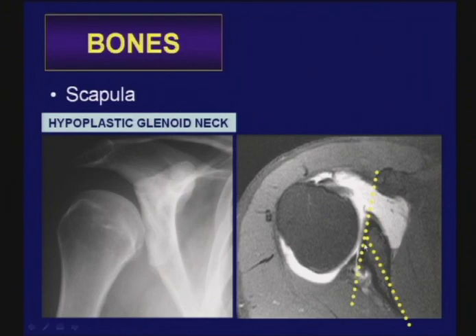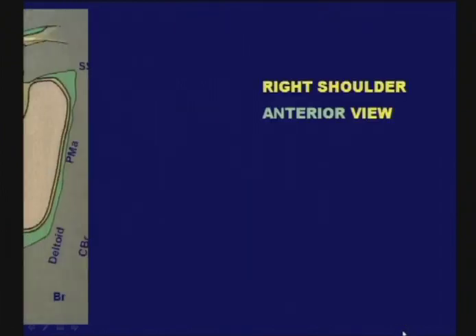I won't be talking more about this condition, but I would tell you it's a very difficult condition to assess because the posterior labrum develops as large as shown here and often separated from the glenoid margin. So trying to decide if there are acquired alterations back here or simply developmental ones becomes difficult. In this case, the anterior labrum was also abnormal, but hard to see in this image.